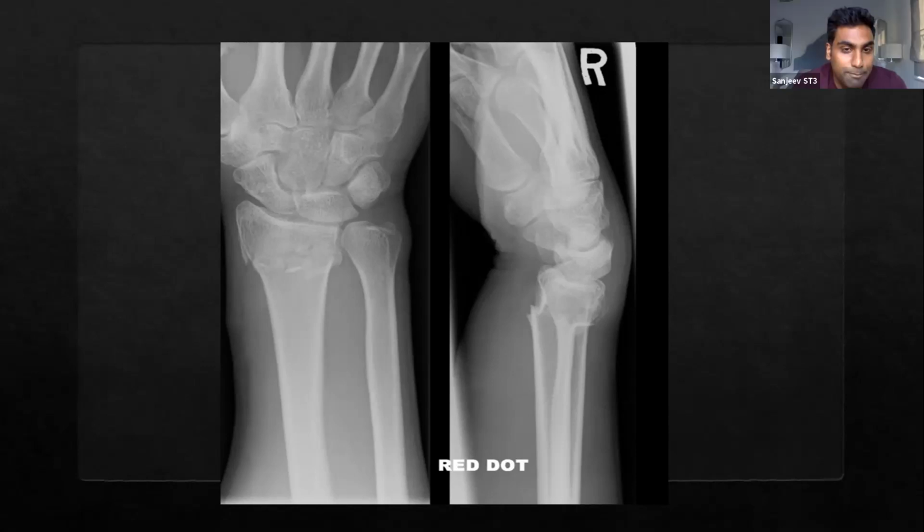Good. So in conclusion? In conclusion, I believe that this is a Colles fracture. It needs manipulation under anaesthesia and putting in a below elbow back slab, and then re-X-raying to make sure that it's in the correct position, followed by physiotherapy. And if it fails to unite, we need to do possible ORIF.